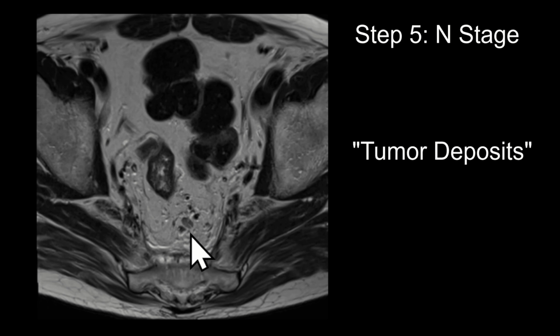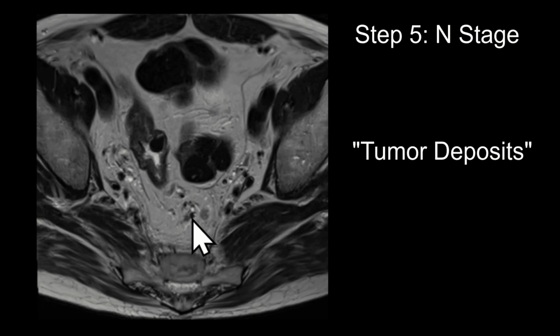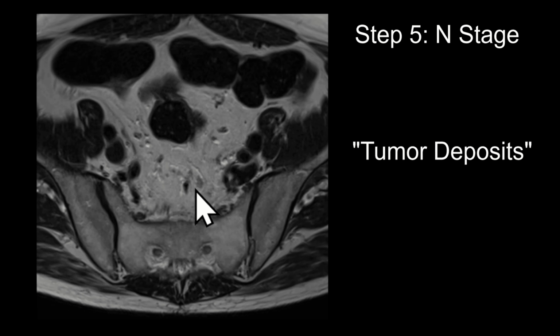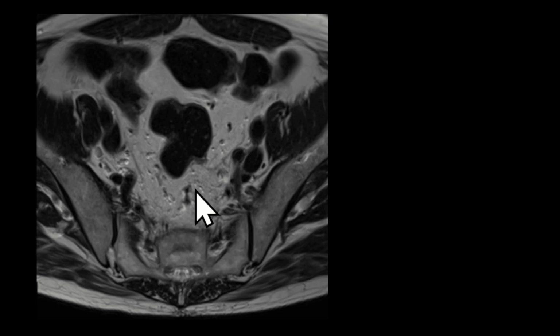So for example, in this other case with some lymph nodes here, you can see that this here is a lymph node alongside the mesorectal vessel. And you can see that for all of these nodes, they're alongside the vessel. Tumor deposits, on the other hand, tend to interrupt the mesorectal vessels, and we'll show you examples of that in our course. The thought is that these have similar prognostic implications to EMVI, but are still being studied in greater detail.